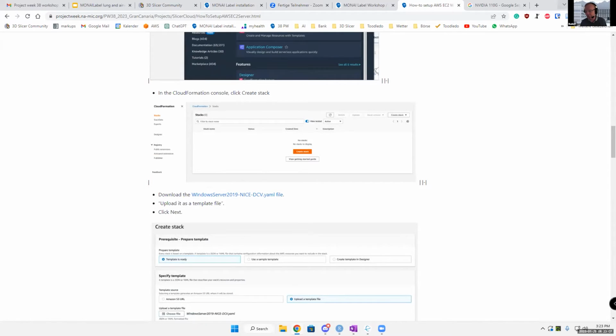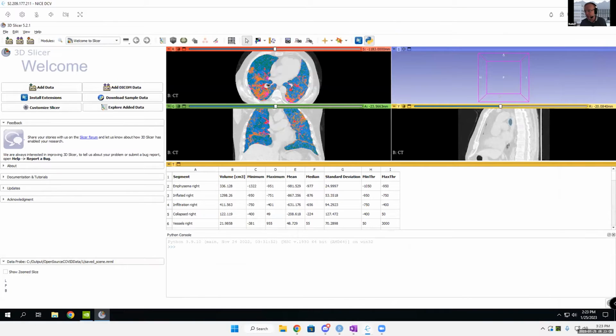And I can just show you briefly that it really works.